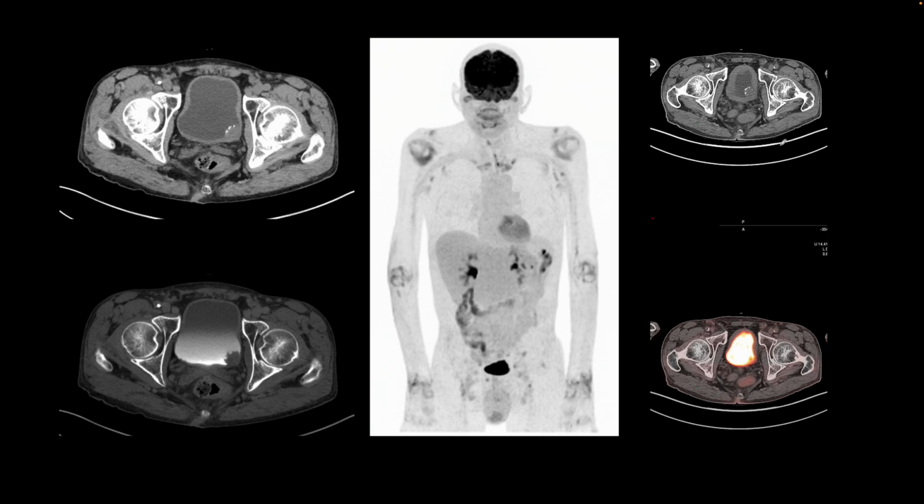Here's our next patient. This patient underwent an FDG PET-CT scan for AML, acute myeloid leukemia. We knew at that time that they also had bladder cancer, because before the FDG PET-CT, they presented with a CT urogram. In CT urogram, we acquire a CT without contrast, which is right here. This CT shows that there is a mass arising from the left posterolateral wall of the urinary bladder, and in a frond-like pattern, this extends into the urinary bladder cavity and has some small calcifications at the surface.